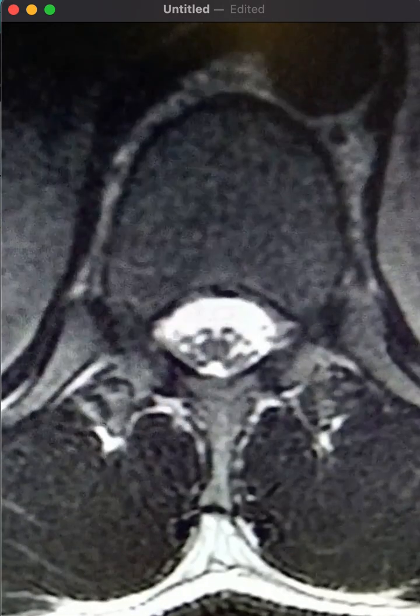So I wanted to create this video since MRIs are super common, and with this particular MRI, the patient really had no symptoms, to be honest. They might have had some back pain, but structurally speaking, there's nothing significant in terms of a nerve getting pinched or a big disc herniation. But this is a pretty good MRI in that it does show some of the normal changes of the spine.